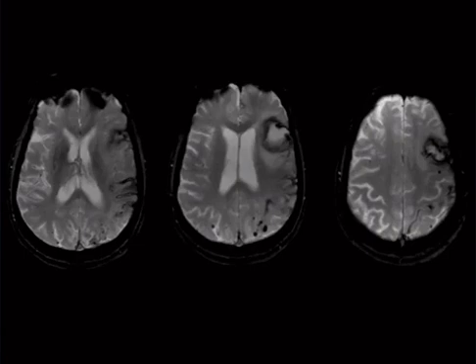We've got a gradient. There are 3 scenarios when you're going to be shown a gradient image. One is this, which is amyloid. You've got multiple different microhemorrhages, in both lobes. Buzzword is bleeds at different stages. It's a little hard to tell here. They're all sort of old, right?